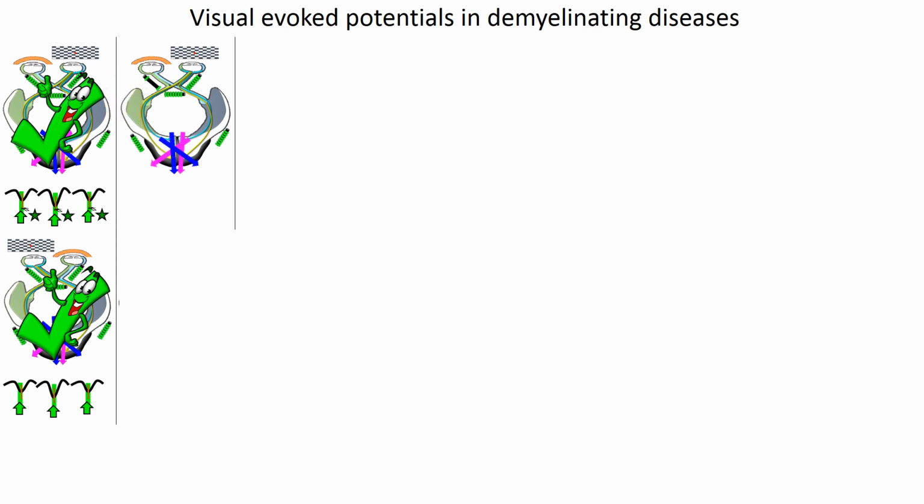In this case, right eye testing produced timely vectors. The timely vectors are represented by the solid color arrows, leading to timely P100s. So the study of the right eye is normal, as will be attested by the normal P100 latency in all the electrodes.